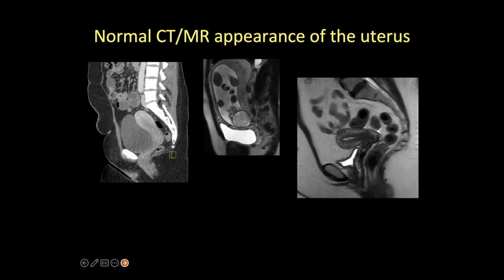The first thing I'm going to do is look at the bones. On the left picture, the bones are bright white, and in the middle and the picture on the right, the bones are darker. Right there, that tells me that the picture on the left is a CT, because the bones are always going to be the brightest thing on a CT image. And on an MRI image, like the one on the right, the bones are always going to be dark.